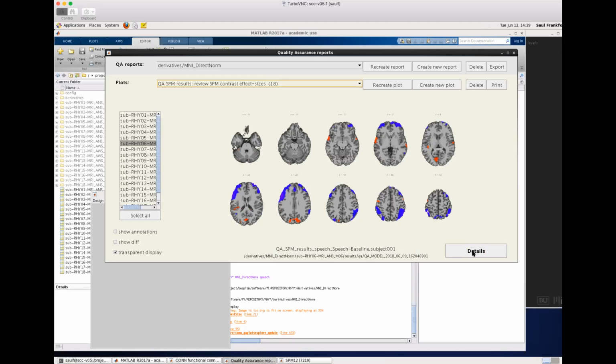Oh, right, exactly. Yes, in the ventricles as well, because anywhere where you look at the average BOLD signal and there is a huge, large gradient of that signal, basically large spatial changes in that signal. When you look at the mean functional, for example, we have a plot for that. So let me just show you. Can I take control of your screen for a second? Sure. Yeah. Okay, let me see if I have a plot here.